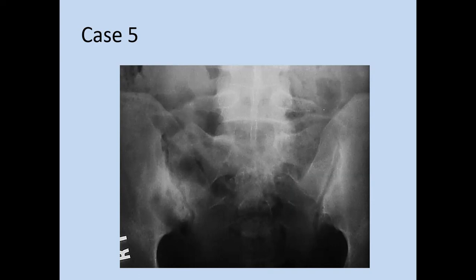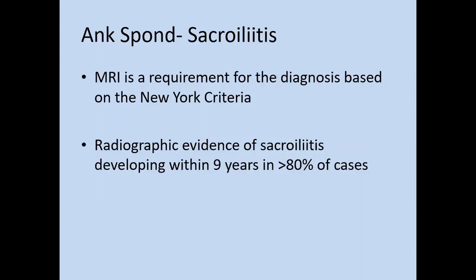Magnified view of both sacroiliac joints, plain radiograph, showing irregularity of both sacroiliac joints, more of the right joint, with subchondral sclerosis and decreased joint space, more on the right, and involving the lower part. Picture of asymmetric sacroiliitis. Yeah, so this is sacroiliitis.